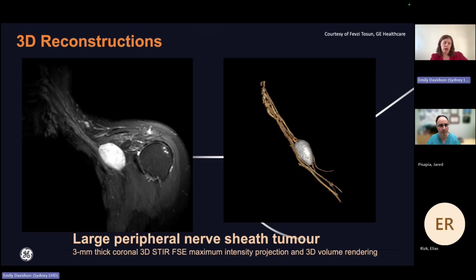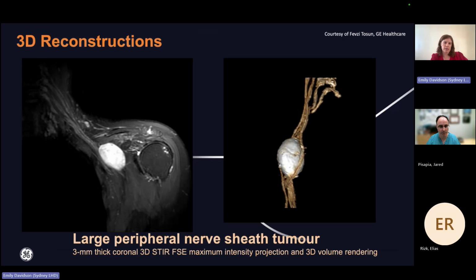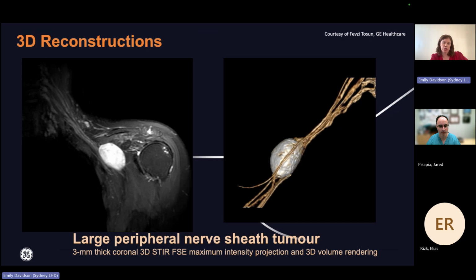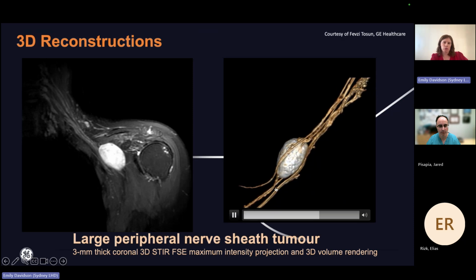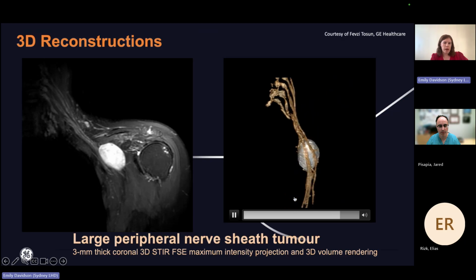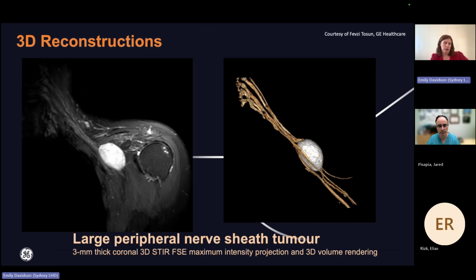The advantage of doing longitudinal 3D sequence is that there are some labs and techniques to render these in a 3D sort of movie-like configuration. And this can be quite useful for surgeons discussing tumors, for example, or lesions with patients. And it looks pretty cool.